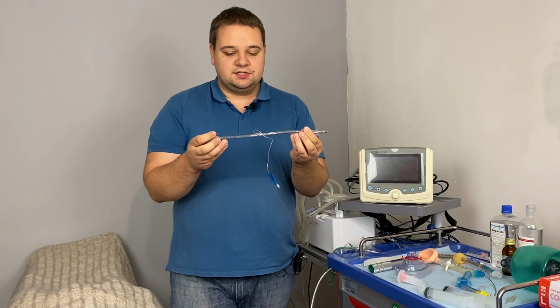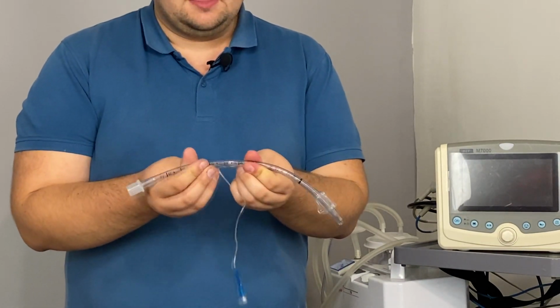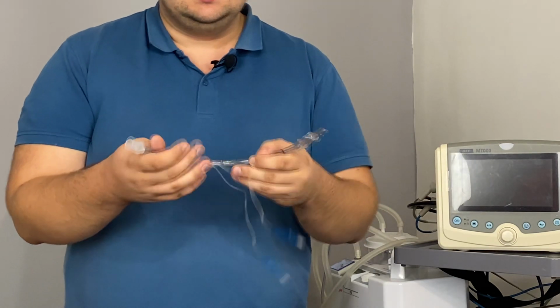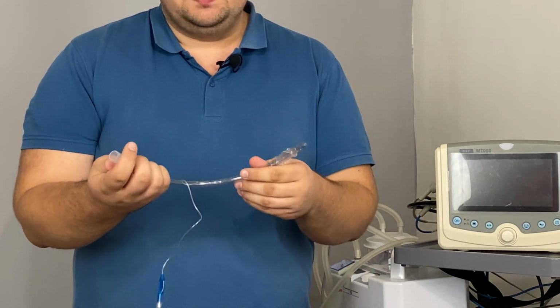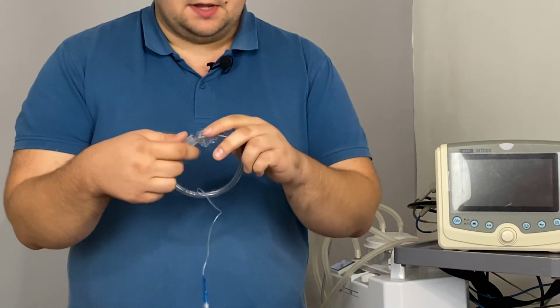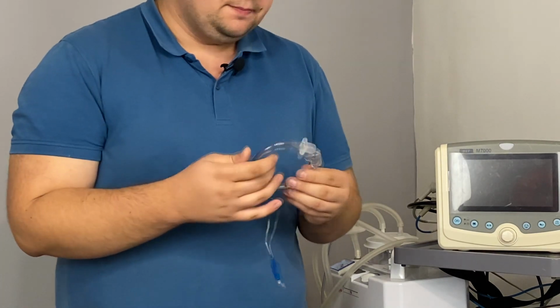So this is the intubation tube, and it looks the same as it used to years ago. Of course, the materials have changed, so this is now thermoplastic. If it's warm, for example inside the body or in the sun, it gets soft, and this helps us to prevent injuries related to the prolonged stay of the tube. But still, this may result in some problems while inserting the tube, but more on that later.